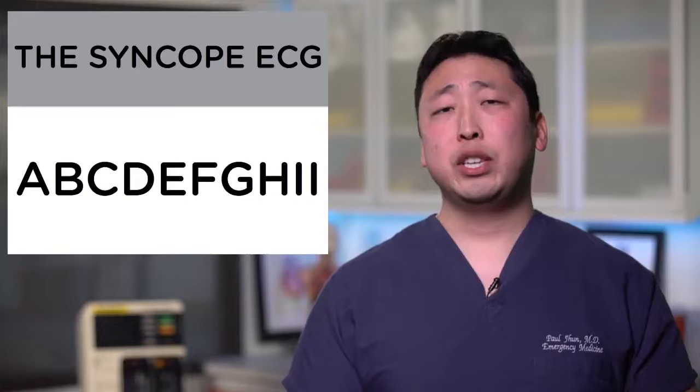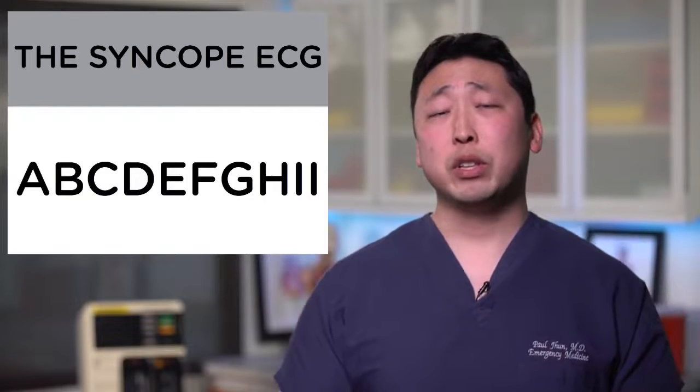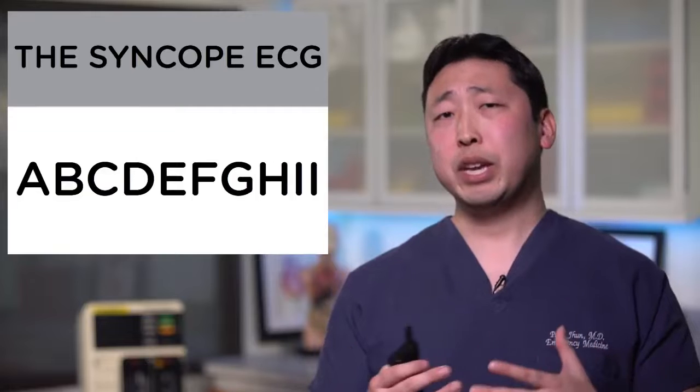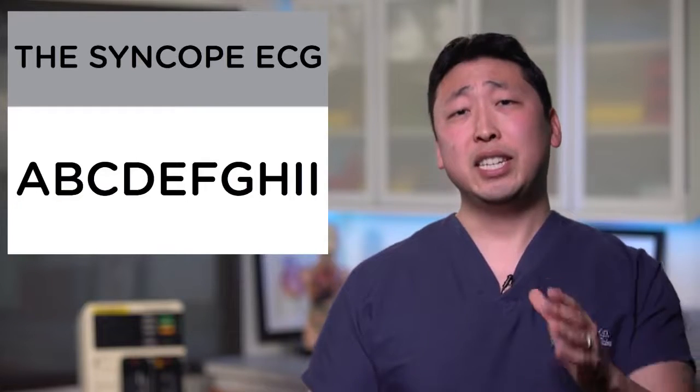C is for corrected QT interval. Look at the corrected QT interval, especially if it's greater than 500 milliseconds. You've got to be worried for a patient with syncope or presyncope if they're flipping in and out of torsades de pointes.